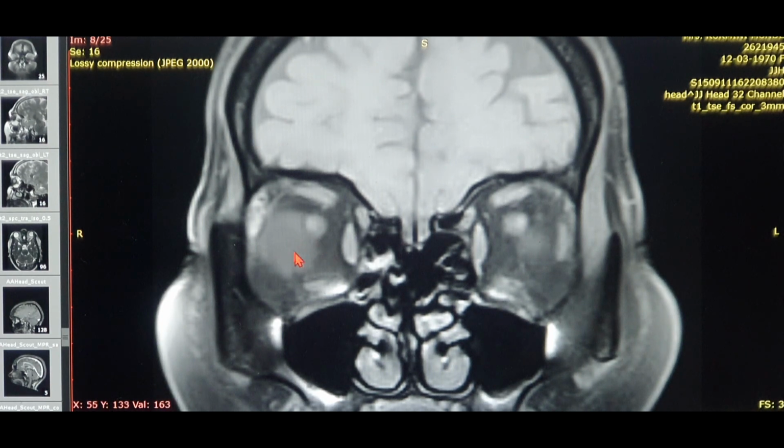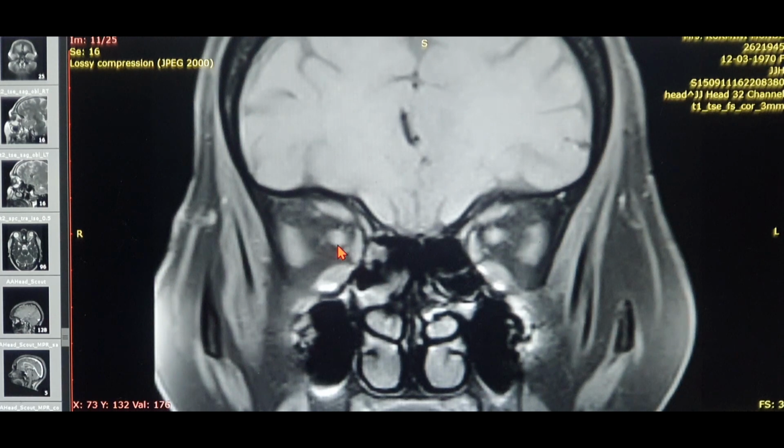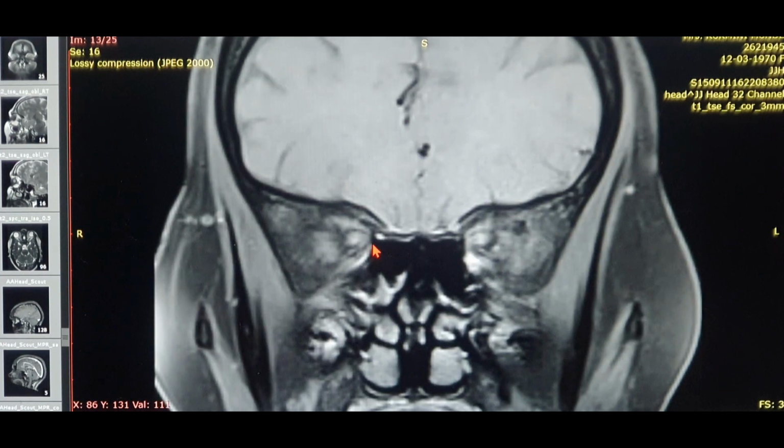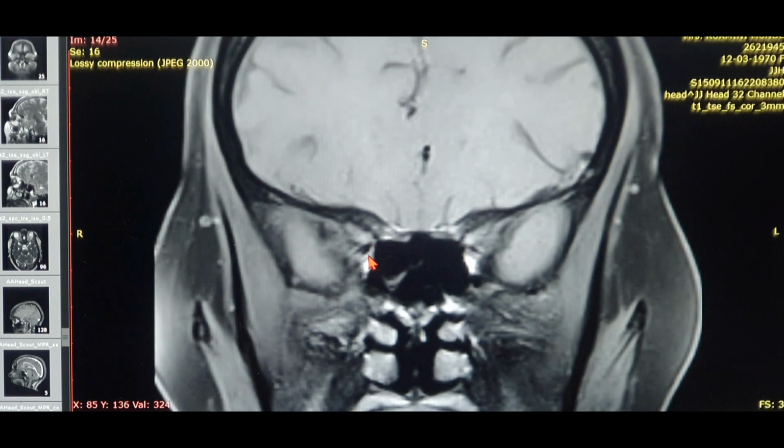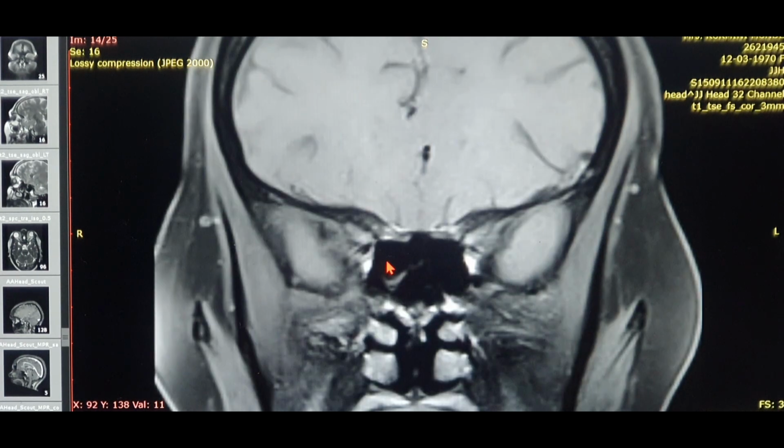That's the eye globe here in the center. And you can see at this particular area, the area of the anterior ethmoidal artery, the beaking is quite evident over here. So you can still keep on going behind, and you will eventually enter up into the sphenoid sinus. Now, you will not be able to visualize the intersphenoidal septa because that's a bony structure. So you're going to see the sphenoid as a whole structure over here.